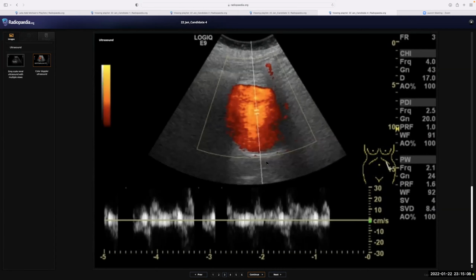low resistance flow, but the way it is completely filling up the lesion, this could be renal aneurysm, but it's too big to be. Okay. So what will you recommend to further elucidate it?